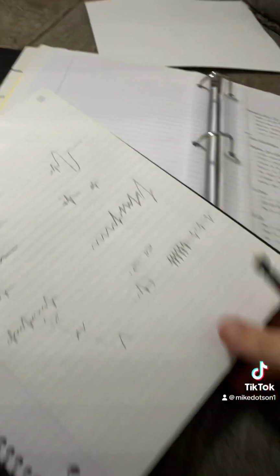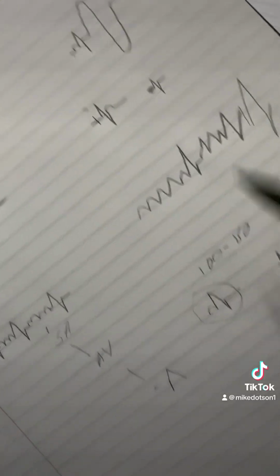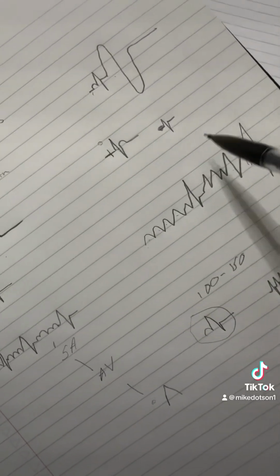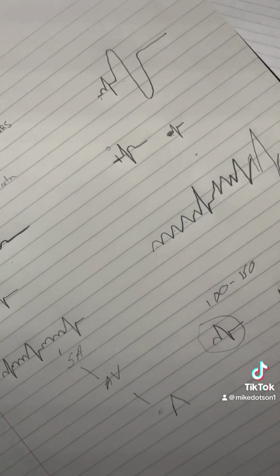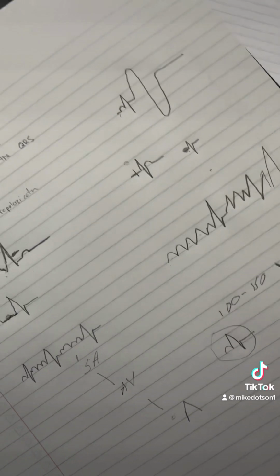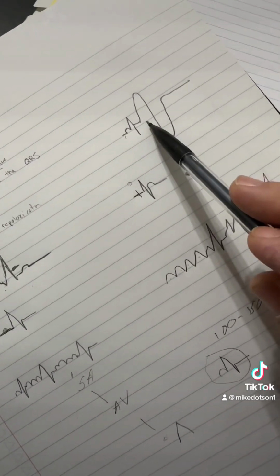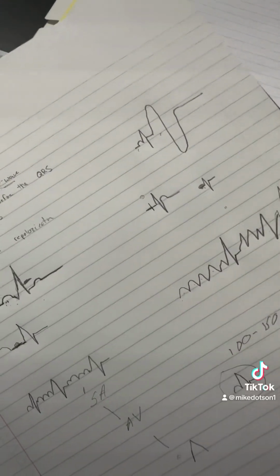So you can see PVCs, PACs, PJCs, whatever be the case. If there's a beat somewhere that it isn't supposed to be, and it's got a P wave, it's a PAC. If it doesn't have a P wave, then it's a PJC, premature junctional contraction. If it doesn't have any of that, it's weird and wonky looking like that there, PVC, premature ventricular contraction.